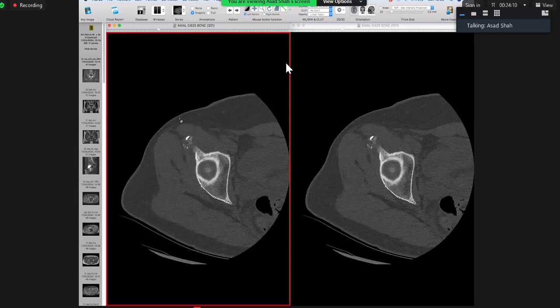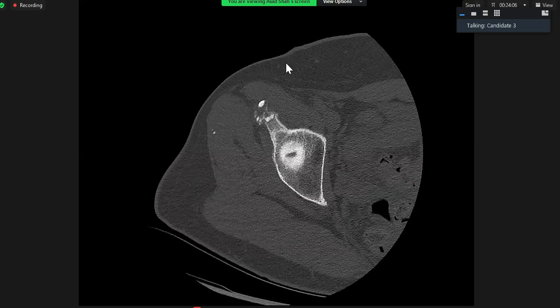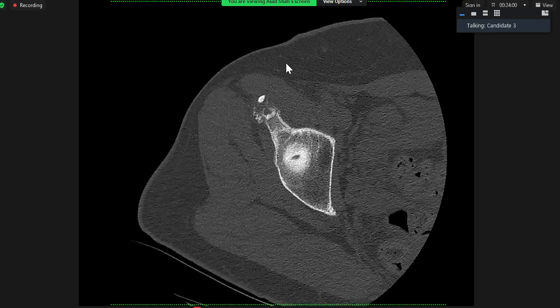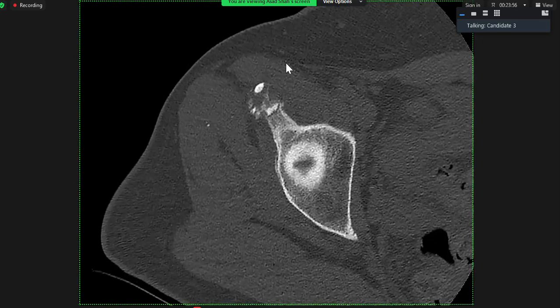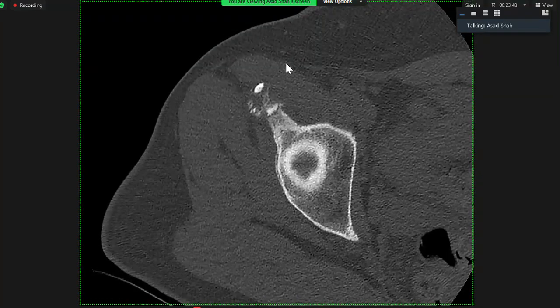But does it look like typical of an avulsion injury to you? No, because the history is not that acute. There is an expansion at the site of insertion, and there is erosion. Yeah, there's an erosion, good. There's a bit of periosteal reaction as well, if you see here. But that's probably just a reactive change.